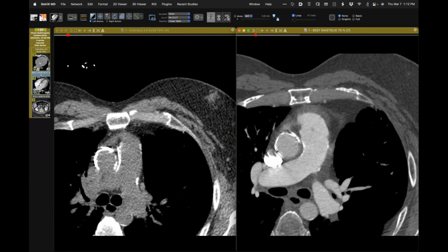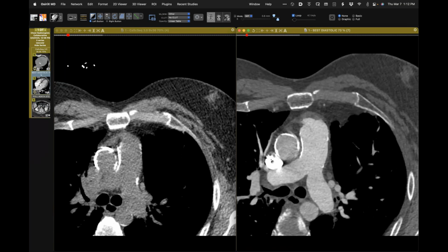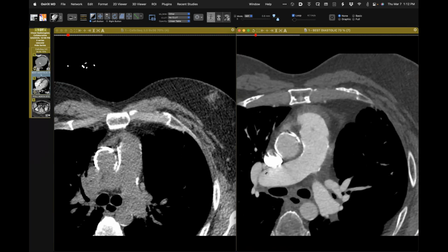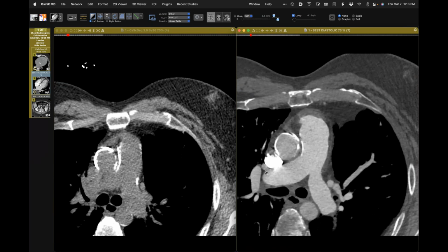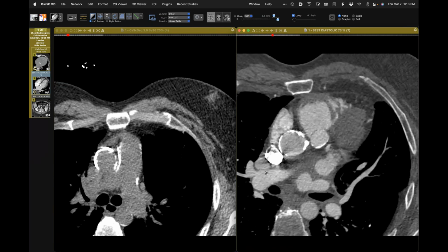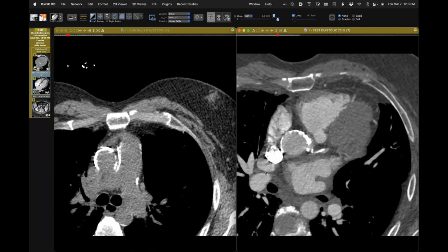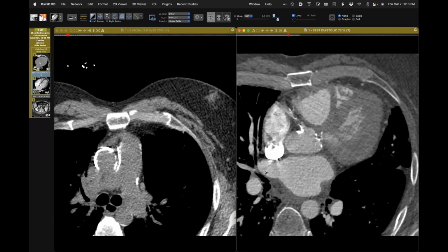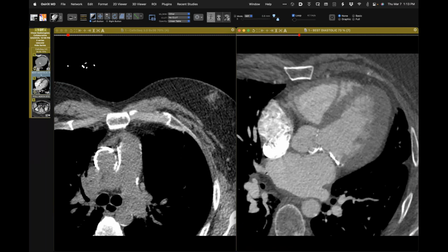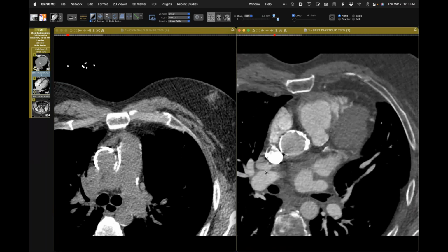As you look at that, this is almost like a porcelain aorta. There's so much calcification in the wall of it. Well, going out on a limb here, things I would think about for that ascending aorta are old aortitis from autoimmune disease, like giant cell or Takayasu from many years ago, syphilis of course, or if there'd been radiation to the mediastinum, that's another possibility. So those are the big three I would think about initially.